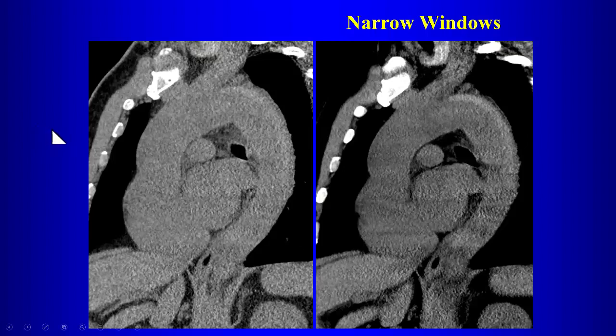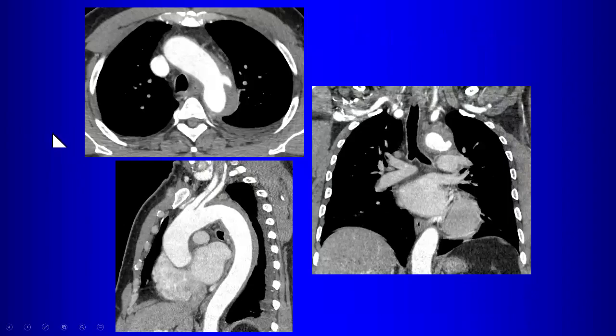And then these are classified the same way, type A, type B. So on follow-up CT, the patient developed this. The follow-up imaging looks like this. So what's going on now? For type B intramural hematomas, they're treated medically, just like dissections. Usually you get a follow-up CT to see how it's doing. Is it progressing? Is it getting worse? Is it healing? So is there a problem here on the follow-up scan?